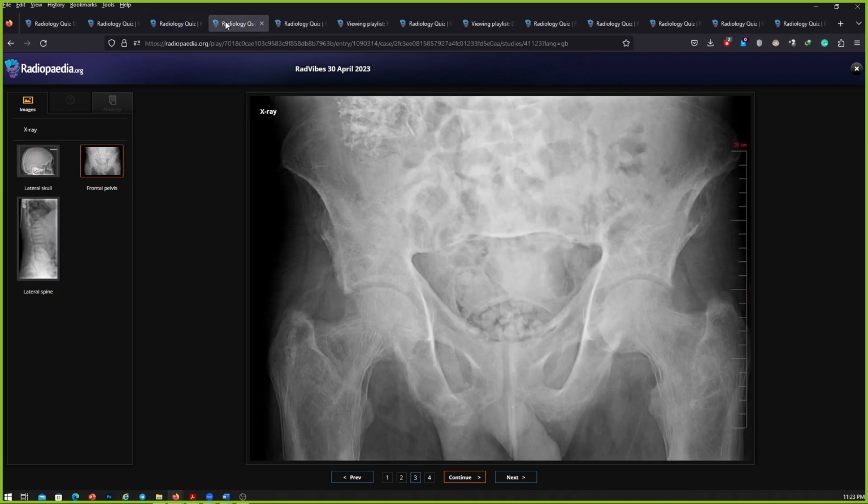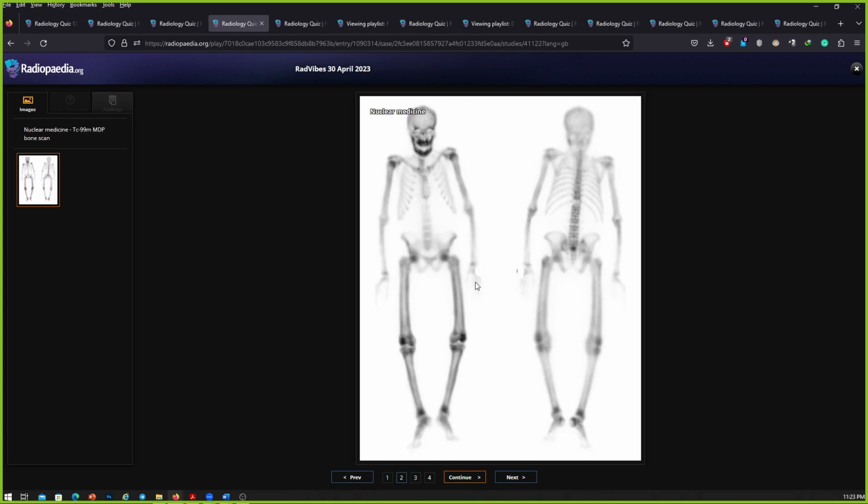And the next case that I gave you was a bone scan of this patient. This is a super scan. You quickly identified that there is no tracer uptake seen in the kidneys, so this is most likely a super scan, and well done in identifying that there is a homogeneous uptake in the rest of the bones, and the distal appendicular skeleton is also taking good tracer uptake, so there is very homogeneous uptake, so this differentiates it from a metastatic bone scan. This definitely is a metabolic bone scan.